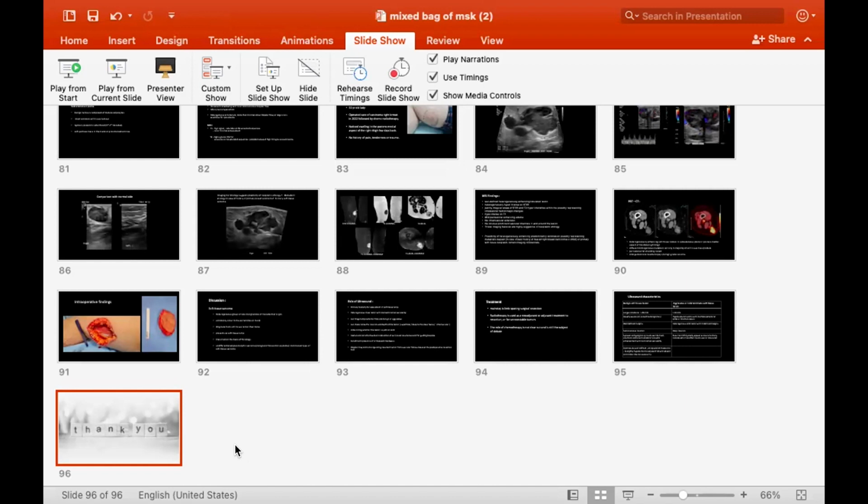Isolated popliteus not involving the capsule, when we are talking of complete tears, like the 2-3 cases you have shown, if we don't address the capsule and the lateral meniscus, then we are leaving something behind.